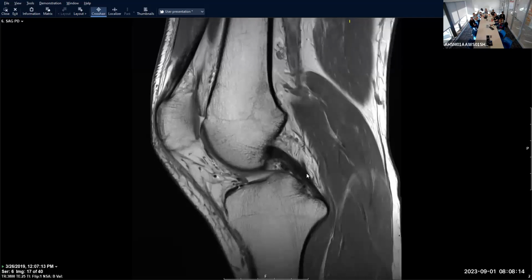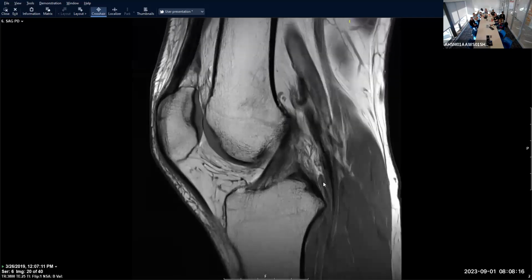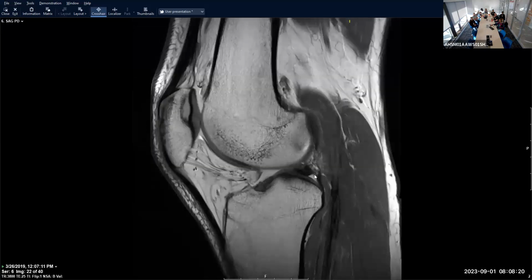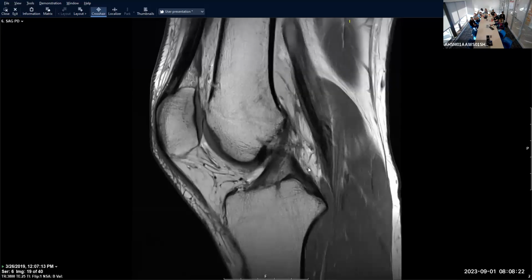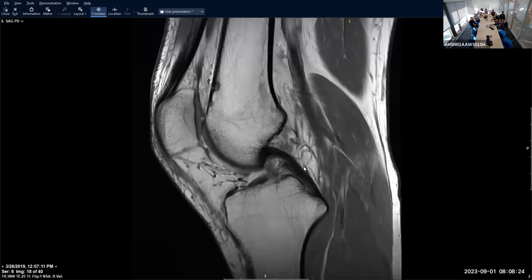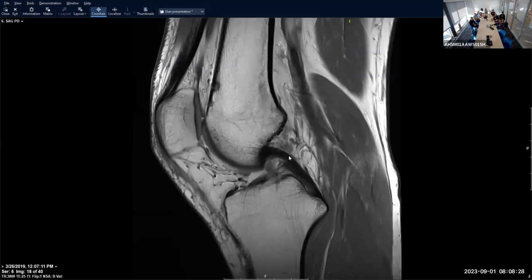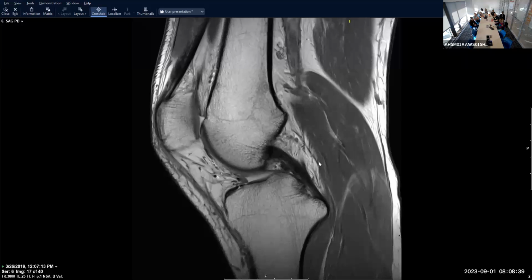Meniscofemoral ligament of Wrisberg. So the Wrisberg rip, you may have heard before, is the phenomenon where you have anterior tibial translation in the setting of an ACL tear. Because the meniscofemoral ligament of Wrisberg is attached to the lateral meniscus posterior horn and it's behind the PCL, when the tibia translates anteriorly and the meniscus is attached to the tibia via its root attachments, there's traction, because the Wrisberg can't go with the tibia since it's locked behind the PCL.